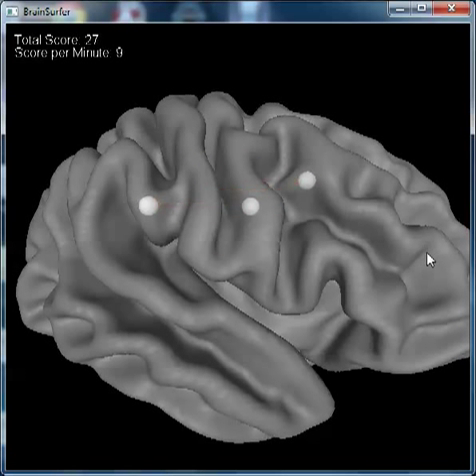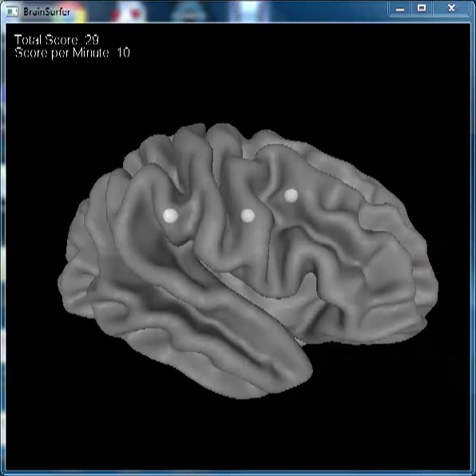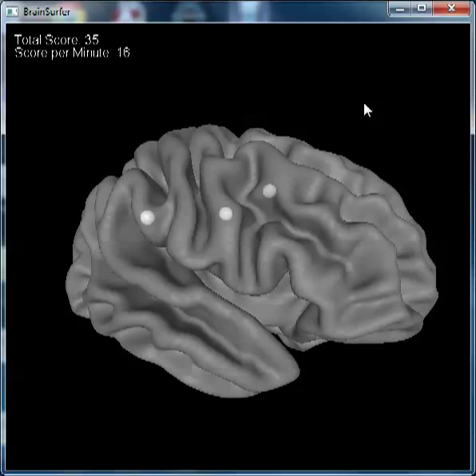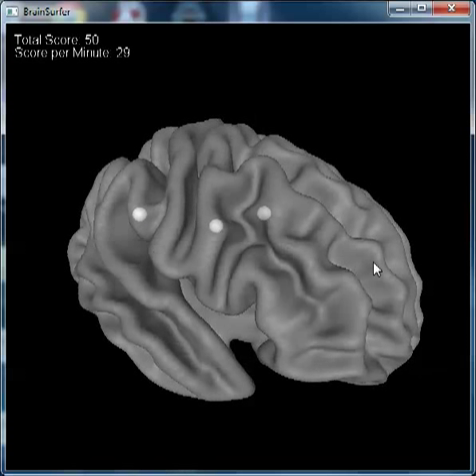This is one way in which Loreta's Z-score biofeedback differs from the BrainSurfer, and the BrainSurfer is like a microscope that isolates the most relevant nodes and connections between nodes and allows a clinician to focus on what the clinician considers the most relevant dysregulation of the network related to the patient's symptoms. In this case, it's these particular nodes.